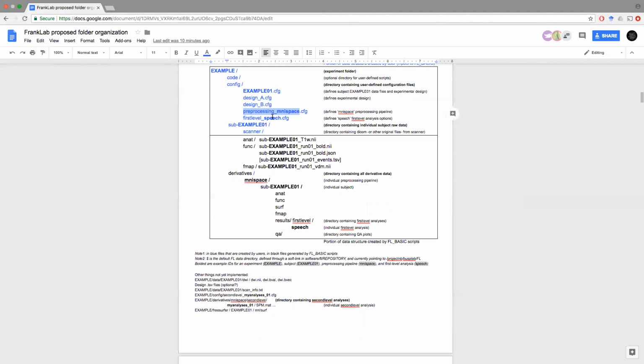For surface-based analysis, instead of running the analysis on the volume, we're going to be running analysis on the surface. What that implies is that we are going to have FreeSurfer compute the actual cortical ribbon for that individual from the structural data for that individual subject. Then we are going to take the functional data, which is also a 3D volume that we get from the scanner, and look at the voxels only within the cortical ribbon. That's what we call the extraction of the functional data at the location of the gray matter voxels. Once we extract the BOLD signal within gray matter voxels within the cortical ribbon, we are going to run analysis only on those surfaces.